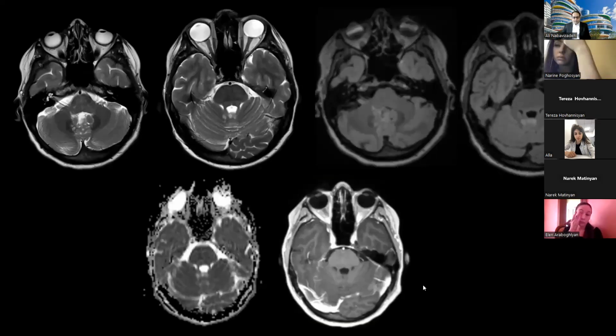So moving on, this was a patient that had an atypical kind of MVNT.